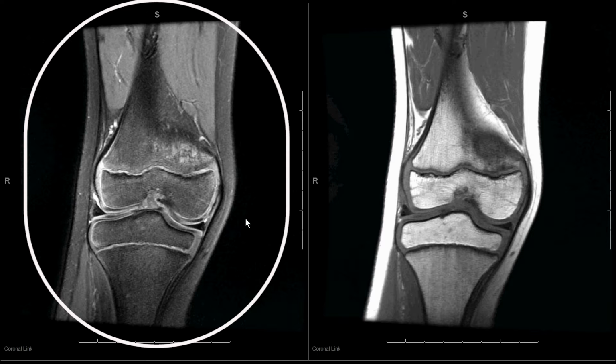Medial collateral ligament tears, therefore, are graded on a scale of 1 to 3. Grade 1 tears are where the ligament looks normal in its signal intensity, but it has a little bit of high signal intensity on the fluid-sensitive sequence, both outside and inside, or superficially and deep to the medial collateral ligament. That's known as a microscopic tear, or a grade 1. Going up in severity, a grade 2 will have a thickened ligament, and it may have some areas of higher signal intensity, again surrounded by edema.